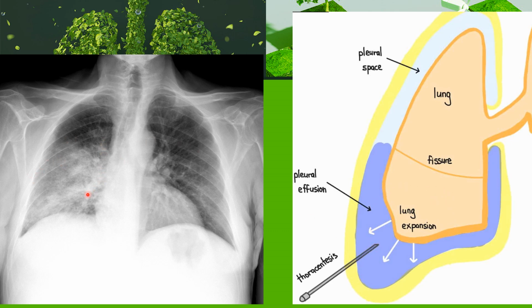So you see this is unilateral. This side, one side, is where the pleural fluid was aspirated. So this side is okay. You can see air is black. Here it is a radiodense opacity. The fluid accumulates at that site immediately after re-expansion. So this is called unilateral or asymmetrical pulmonary edema, or re-expansion pulmonary edema.